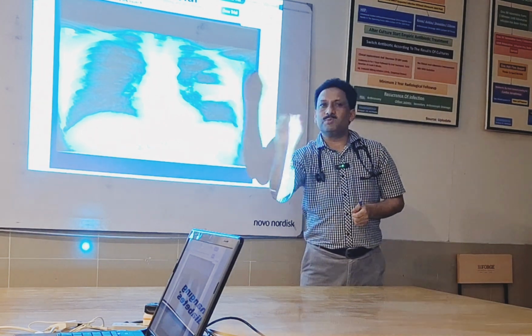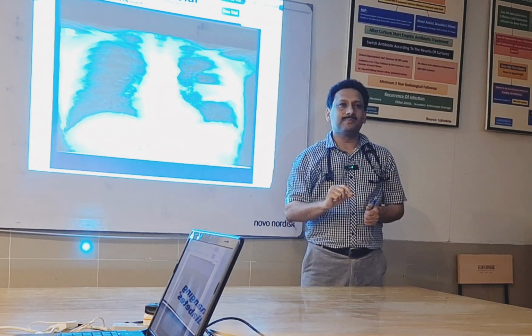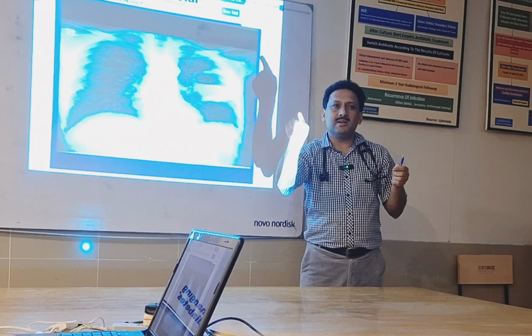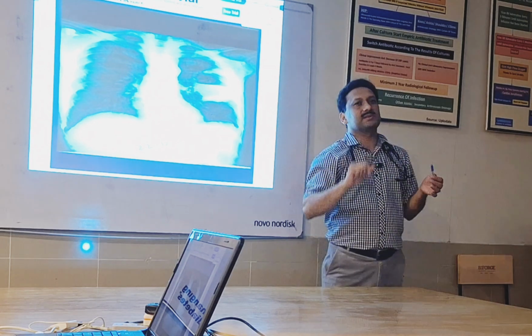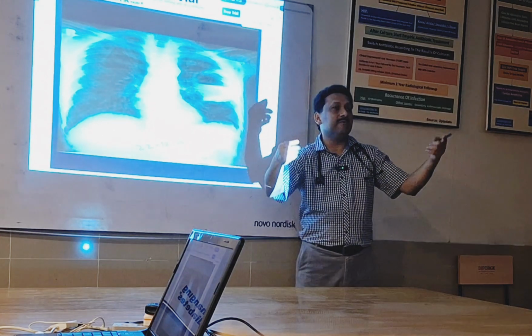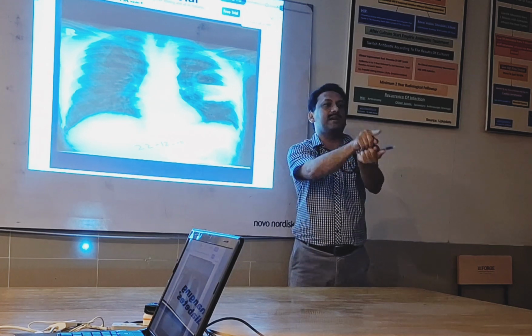If that infection was tuberculosis, if that infection was pneumonia, there will be homogeneous and non-homogeneous infiltrates. And with those surrounding infiltrates, if you are finding a cavity, you label it as a cavity with satellite lesions. So there are infiltrates, infective focuses which damage the lung. Made a cavity, few of the infiltrates are around, you label it as cavity with satellite lesion.